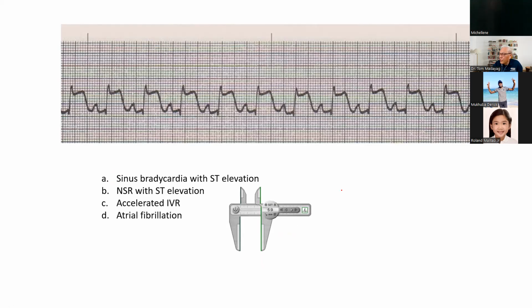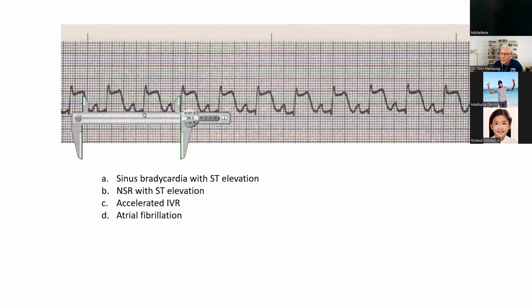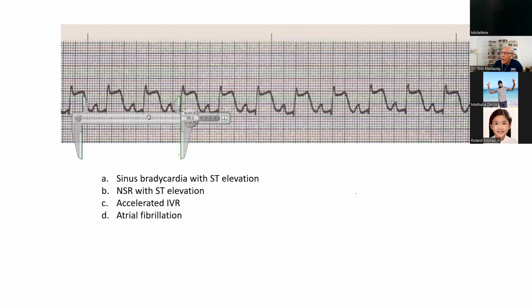All right, I have a ruler here, and as you could see there is going to be a measuring device that is going to establish what the baseline is. The baseline is the line that is after the P wave. So it's known as the PR segment right here. This is the baseline. So technically, the baseline should all be the same. Okay, should be in the same plane. And I don't know why it is writing erratically.